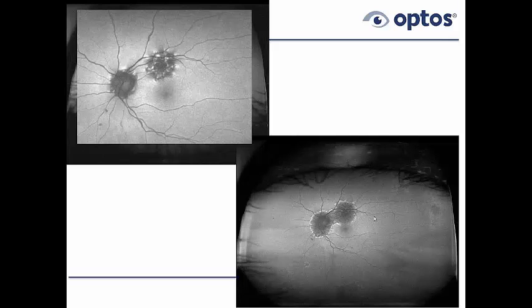It seems like you're getting a lot of information from these images, but again, if the patient has symptoms at all, flashes, floaters, those kinds of things, then I think it certainly makes sense to go ahead and dilate as well. Let me tell you about one of the cases out of those 100 that we're publishing in this book.